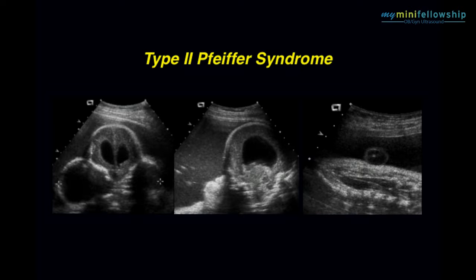Here is a type of abnormality that you may see. This is called Kleeblatt-Schädel or cloverleaf skull deformity. You see the 1, 2, 3 leaves of the cloverleaf. These protrude out laterally. Here you see in the mid-sagittal plane that these fetuses have a very flattened nose and a very protuberant forehead.